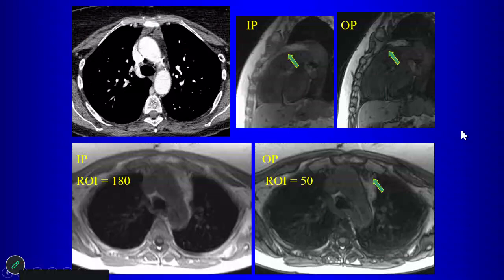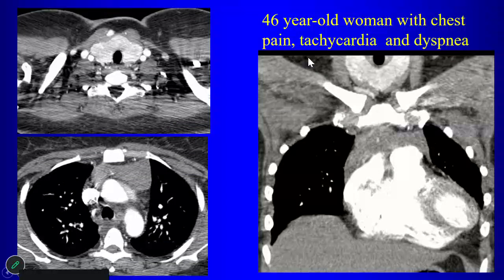So here's another patient with myasthenia gravis. This one had the smaller lesion there. And then we can see here, it's a little bit harder to see. There's the arrow, there's the in phase, there's the out of phase. So you can see that that area is dropping out its signal, okay? So again, this is another example of thymic hyperplasia, okay, in somebody with myasthenia gravis.